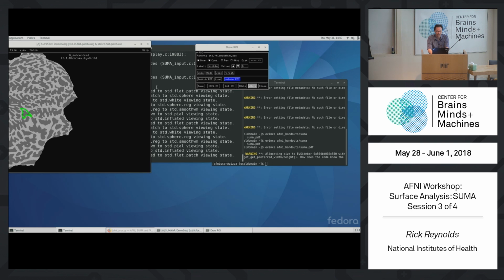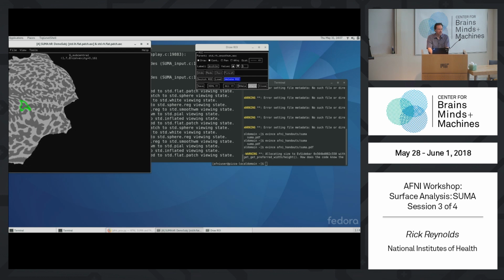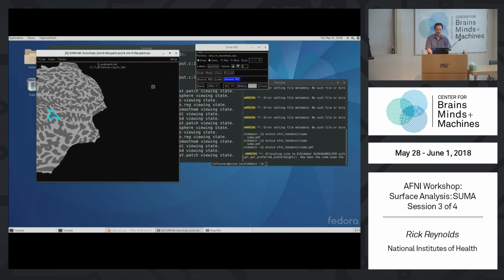So let's just finish this up. I don't want to take a lot of time with that. I almost connected it. You can either connect it yourself by drawing, or you can click on join here. There's undo, redo, and join. Join will connect your first point to the last point, just the last step to make this a closed circuit. When I click on that, you may or may not notice, the color changed from green to this light blue, a different color just to tell you you're in a different state. Now this is a closed loop.